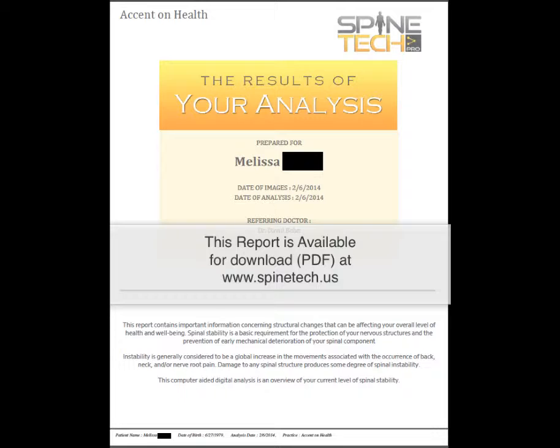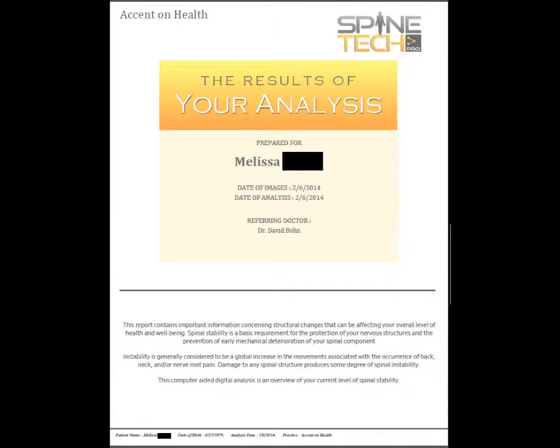It's not all the analysis that this software does, it's about half. So you can use what you want. The other thing that you'll see is these boxes here. Now those boxes represent the patient's last name, and it's been blacked out, so that's why it appears that way. You see another one down here.